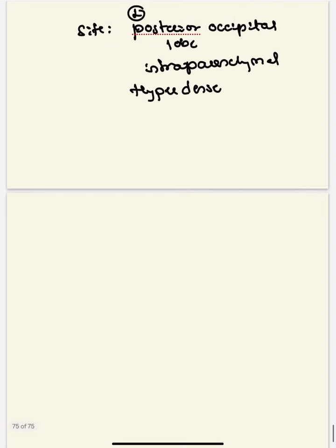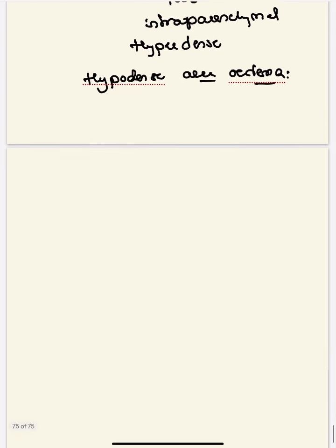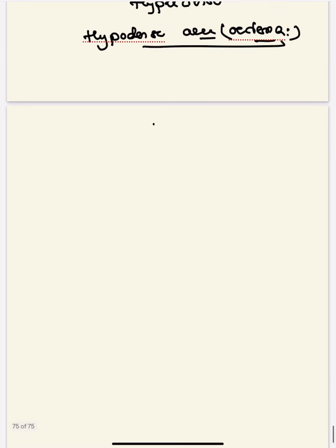So this is the interpretation. Size they have not given, but obviously it is more than 2 centimeters. So this is suggestive of edema, and this is a bleed.